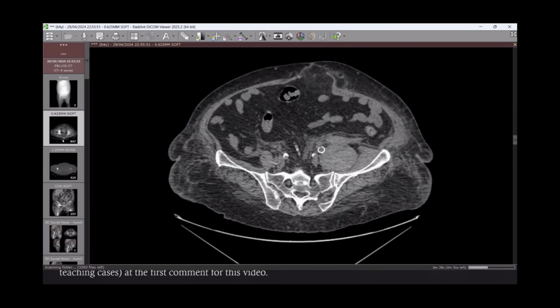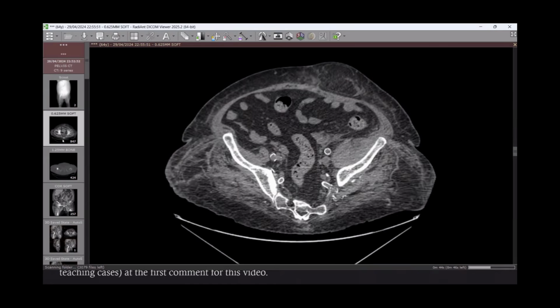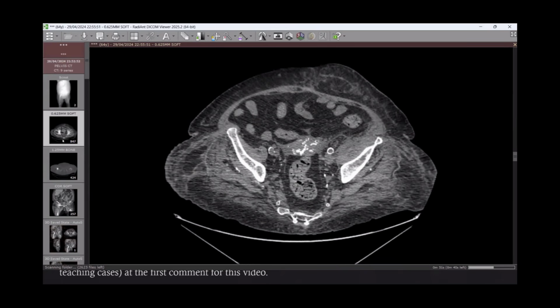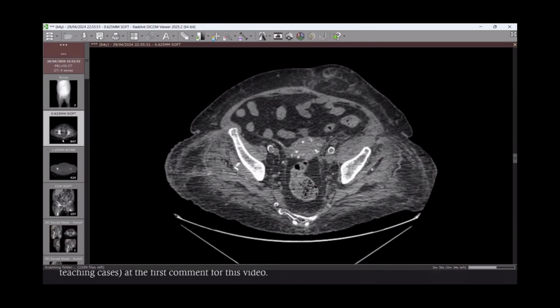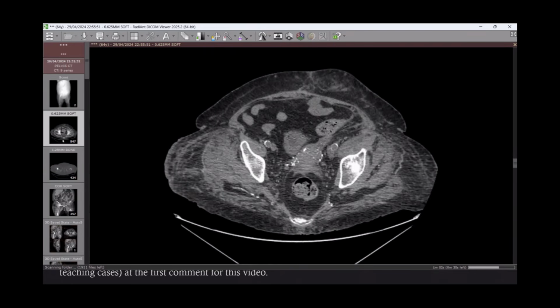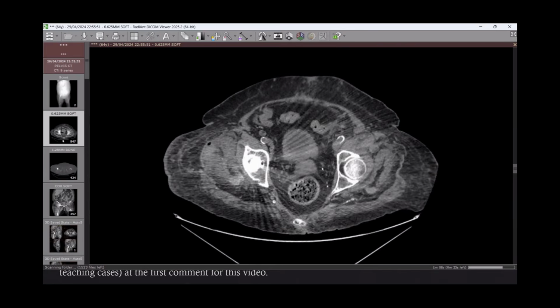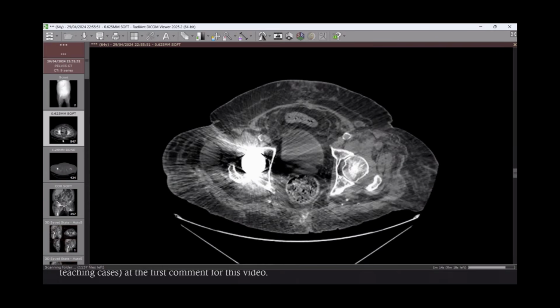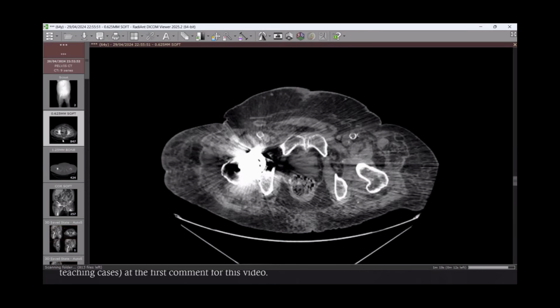In the pelvis, from the first images, there is smudging of the left-sided subcutaneous fat with a large soft tissue seen along the left iliopsoas muscle, with bulkiness of the left iliopsoas muscle down to the pelvic region. In my routine practice, I will check the whole images because this is a trauma patient, to see if there is any evidence of fracture.